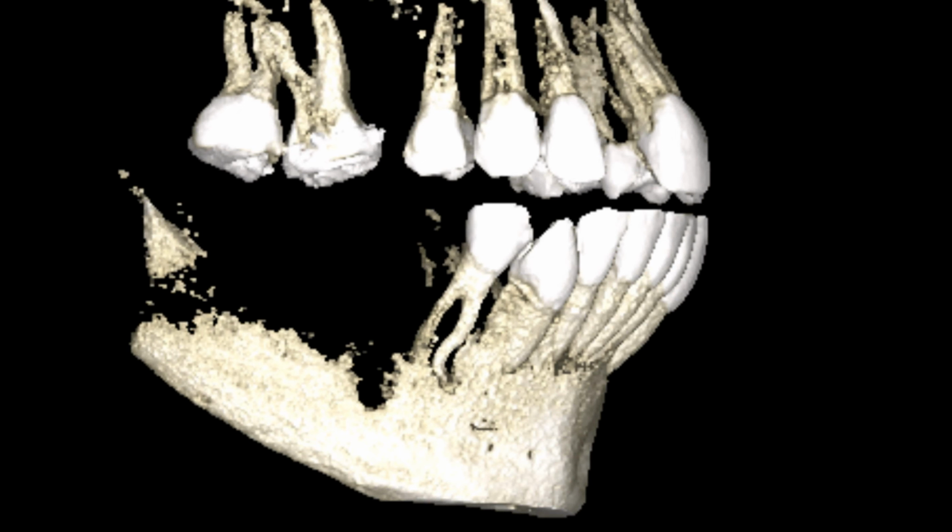And again, if you had to perform the root canal on this tooth, wouldn't you want to know that you're dealing with this? Instead of having to determine that when you go into the access and realizing then that it bifurcates and still not sure whether it has 2 canals or 3 canals, right?